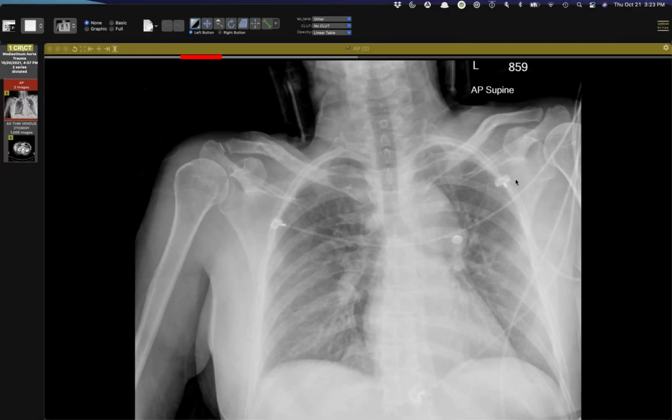All right, you should see a Roentgenogram. We do. And yeah, this is a trauma patient. You can see they're in a neck brace and they were in a motor vehicle crash. I'll let you look at it for a second, but hopefully everyone's eyes go to this area.